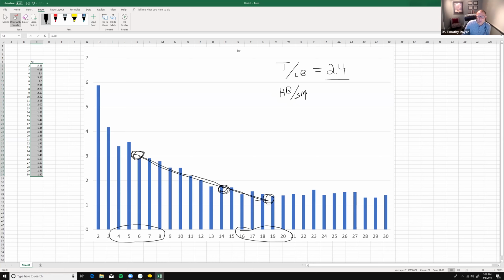Ideally, what we'd love to see is that number less than 1. Well, you can see right away, if I calculate these high beta frequencies and put them over top of these frequencies, that's not going to be less than 1.